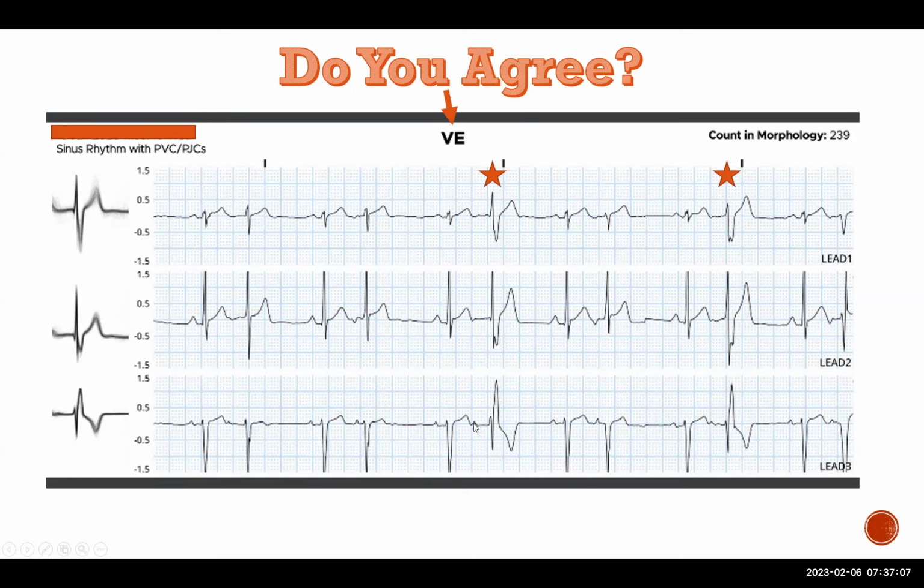So when we get more and more premature with atrial contractions, we get decrement in the AV node, and we get decrement in the His-Purkinje system. That's a normal feature of conduction. Whenever we do atrial extrastimulus testing, we get earlier and earlier, and we see the PR or the AH interval lengthen. And there's also a little bit of HV lengthening as well, but we don't measure that because the His-Purkinje system decrements a little bit less or a little slower than the AV node in most patients.